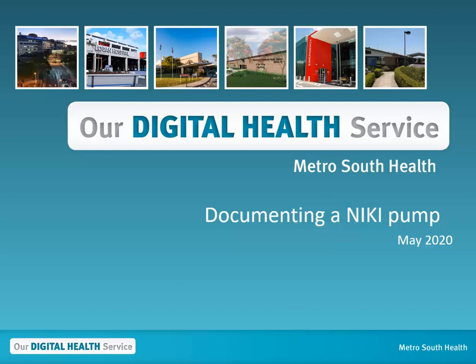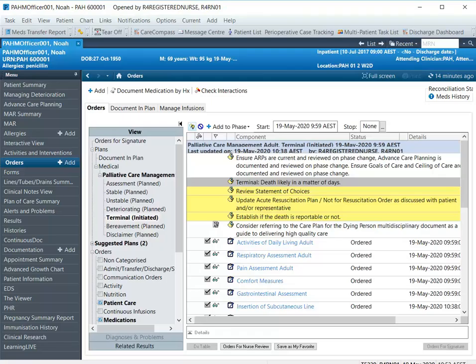This video will demonstrate the documentation of a NIKI pump. Subcutaneous infusions for palliative care can be managed by the Adult Palliative Care Management Power Plan, the Terminal Care Management Power Plan, or can be ordered independently depending on reason for the infusion. Power plans contain patient care tasks as well as orders for the subcutaneous infusion device. These tasks, when checked or ticked, will populate your care compass.